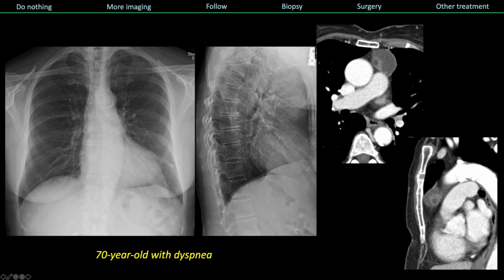And the lesion is pretty well encapsulated. It's got soft tissue and fluid in a 70-year-old, sort of incidentally discovered. The patient just had dyspnea, which is probably not related to this. This turned out to be a thymoma, and that's what we called it ahead of time.